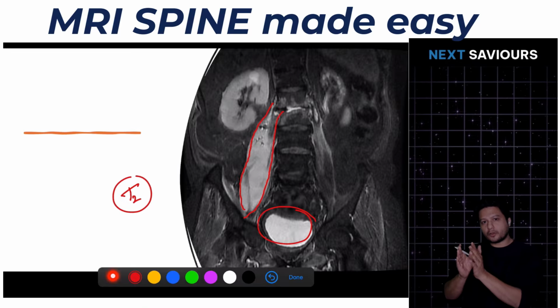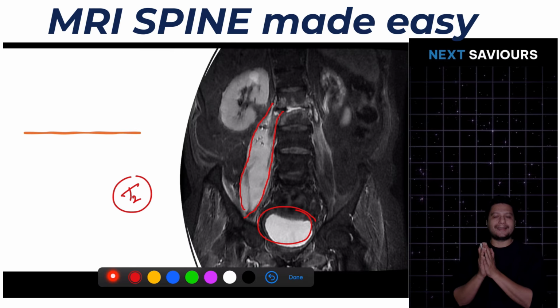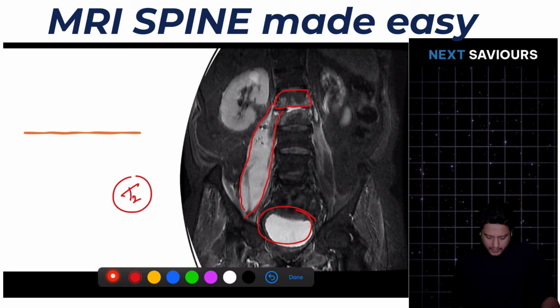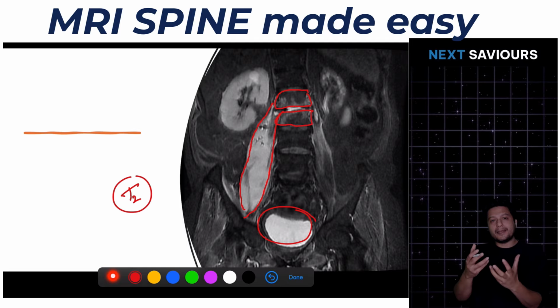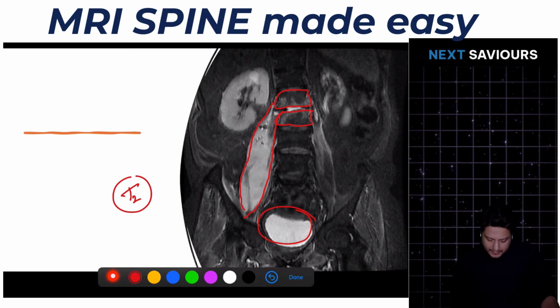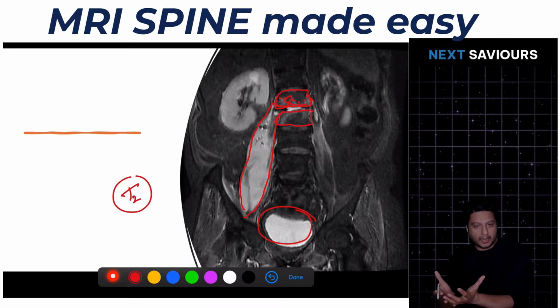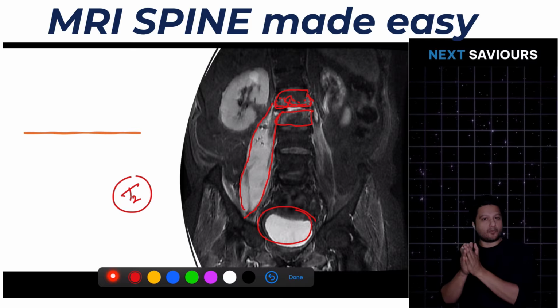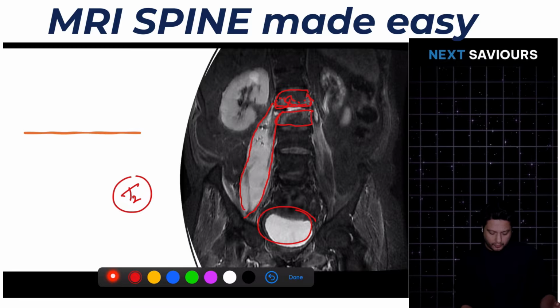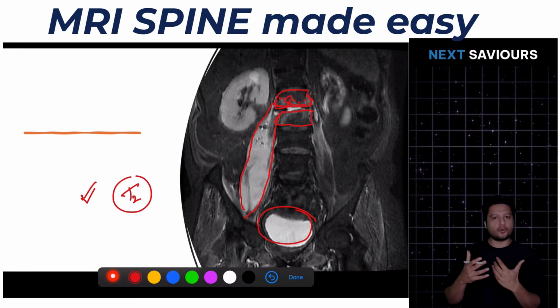And if you particularly focus on the origin of where exactly this psoas abscess is getting created or developed, then here you see the disintegrative changes along with the erosions which are appearing at the level of the vertebral body. Not only this, you can very clearly see the white patches, which is nothing but the inflammatory edema, which is going to also appear white on T2 weighted images, and thereby confirming the diagnosis of tuberculosis of the spine, that means Pott's spine, leading to psoas abscess, that means cold abscess.